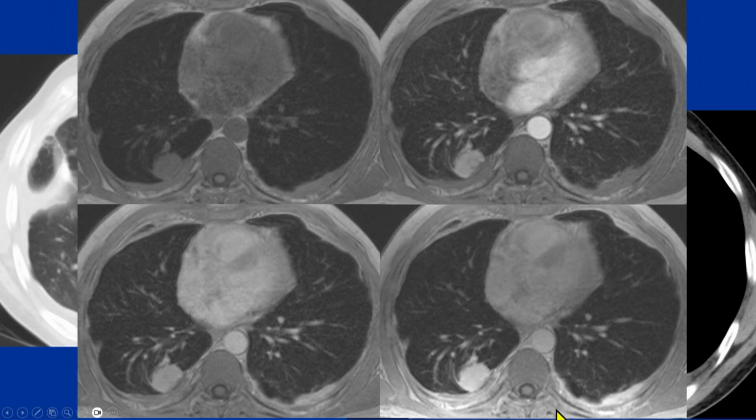And what's interesting is on delayed phase, as you would suspect, the pleural thickening starts to enhance more as the contrast gets in there. The round atelectasis also starts to enhance more over time. So if you ever want to do this for your VIP patient in an inappropriate manner, you could do this as well.